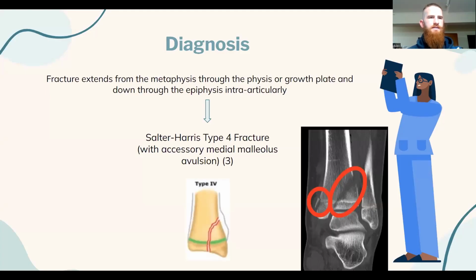From our CT scans and 3D reconstruction, and as Jin described, we can see there is a fracture beginning on the distal posterior surface of the tibia, mediolateral in orientation, and widening the more distal it travels obliquely down to the growth plate. After crossing the growth plate, it changes orientation slightly to be more anteroposterior through the epiphysis and exiting intra-articularly. When describing fractures involving growth plates, they can be classified using the Salter-Harris classification system.